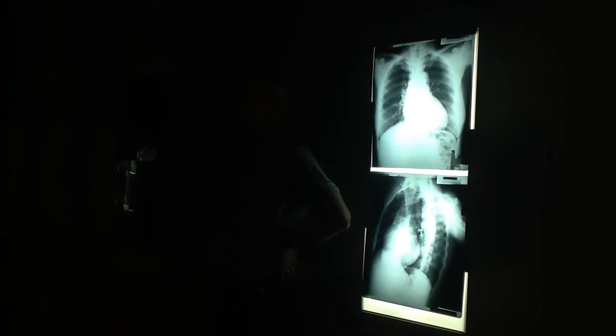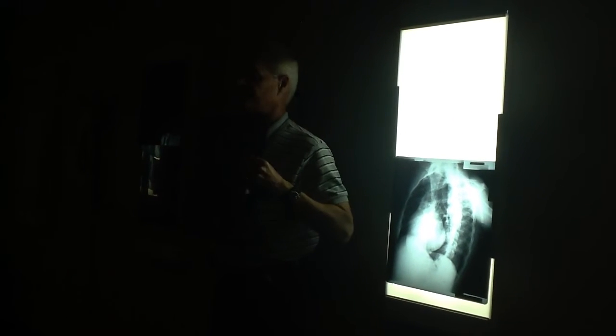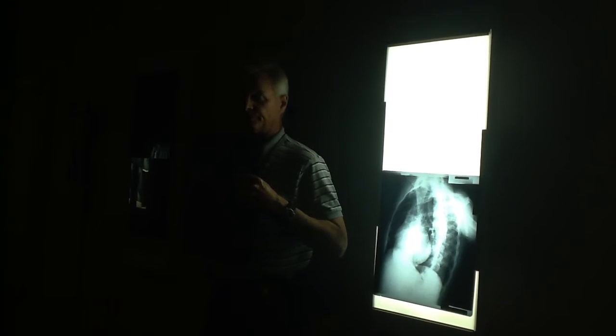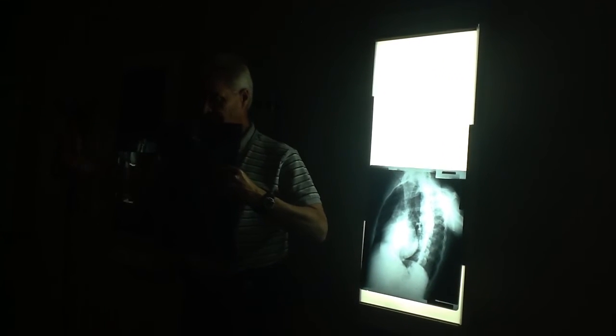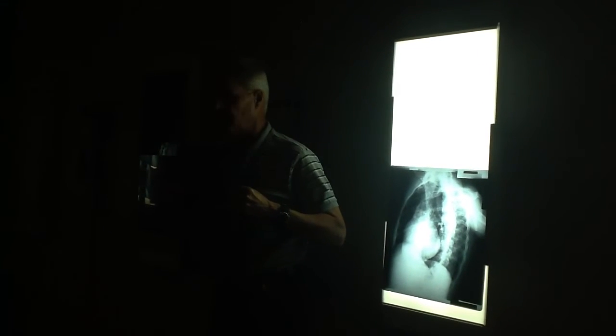So what should we do to go from here to here? Here's the patient, right? That's the PA view. And the cassette is here, right? The tube's back there. That's RAO. So which way did we turn the patient relative to here? And your face is looking at this. Your face and the cassette are the same thing, right?